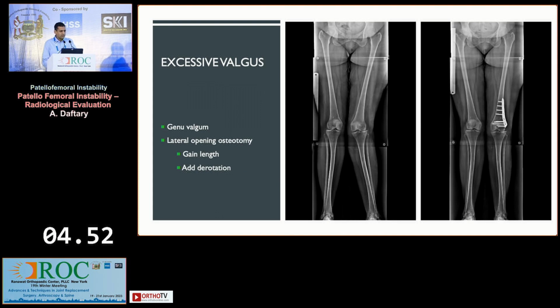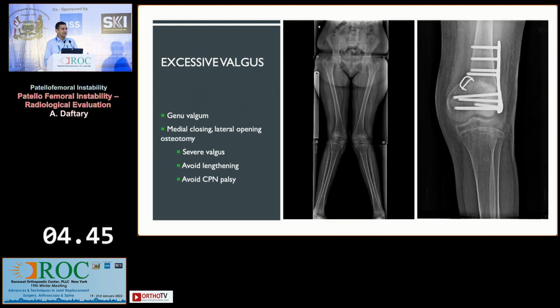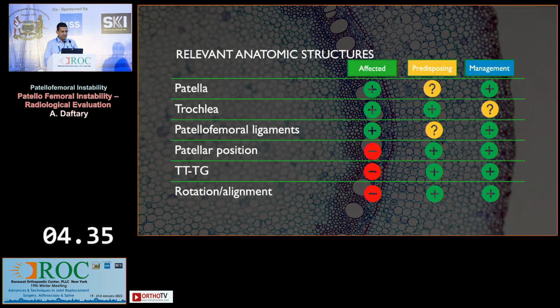Here's another patient who had a lateral opening osteotomy because they wanted a little more length and some derotation component to it. And this is one who had very excessive valgus, and they decided to go with both a medial closing and a lateral opening osteotomy. So scanograms do play a role in your assessment and management of this.